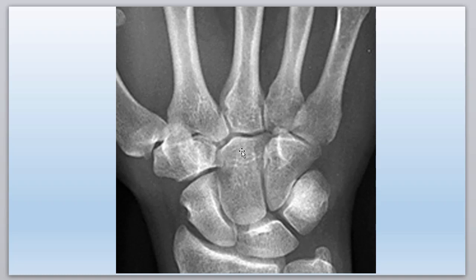Okay, so the distal row of carpals. So we have this one right here, and this is the trapezium. Remember my mnemonic for that? If you always start with a scaphoid when you're naming, and then I always forget, so I have to hesitate. I say it and that tells me it's the trapezium, if that makes sense.